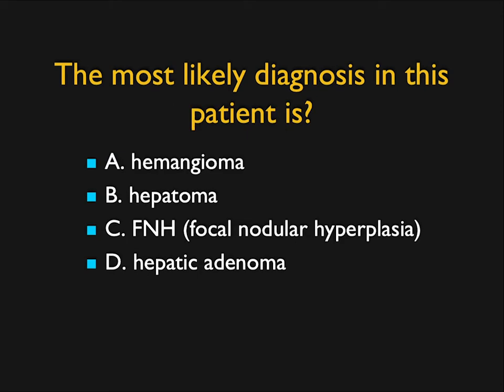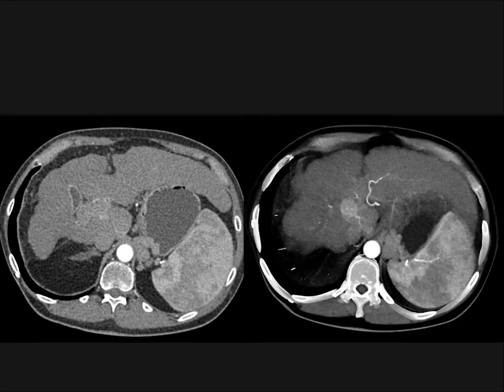In this case, I asked for the most likely diagnosis. Forget the answers I listed. Look at the liver. The liver on the axials and the volume rendering is markedly cirrhotic, and then you see evidence, best shown on the 3D, of a 2.5 centimeter hypervascular lesion. And if you look back toward the venous, you can see the lesion is there, and there's some neovascularity.